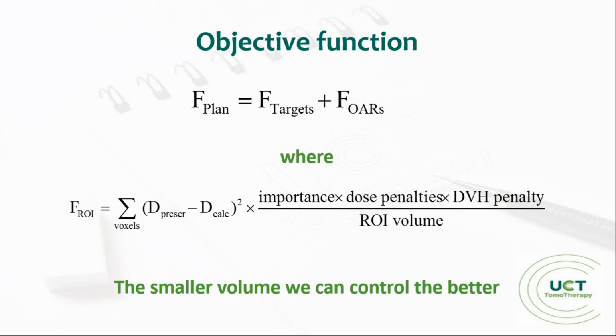Here you can see that every impact from every structure is divided by its volume, and the smaller the volume we can control, the better.